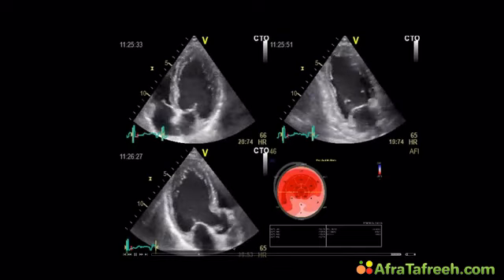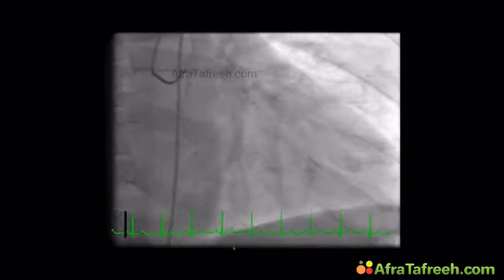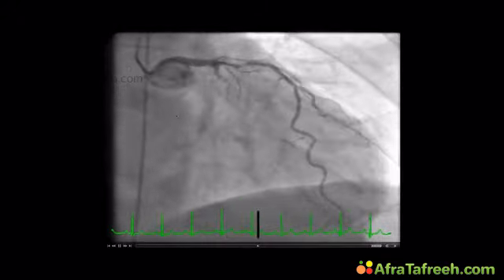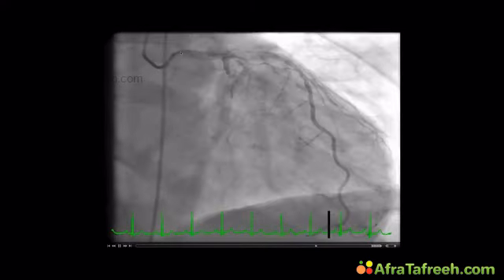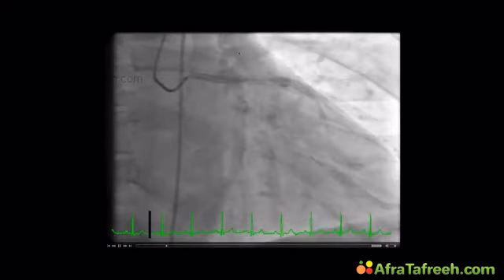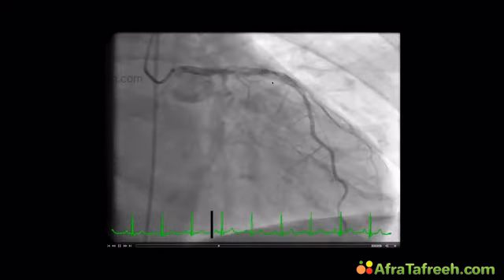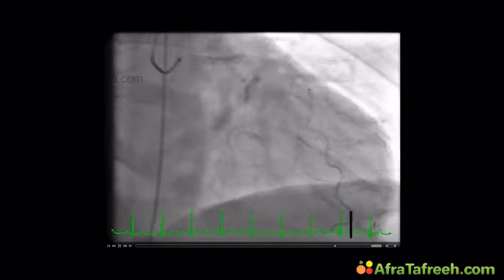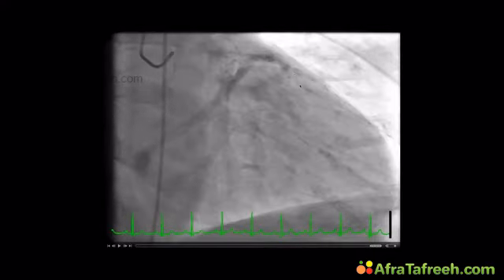Okay, this is again the speckle tracking I just showed you, and now this is the coronary angiogram of this patient. Again, the catheter is stuck here in the left main. This is the left main, which is a fairly long main stem, and then the vessel splits into the LAD, which looks fairly okay. There's no stenosis I see here. It's just some wall motion abnormalities.